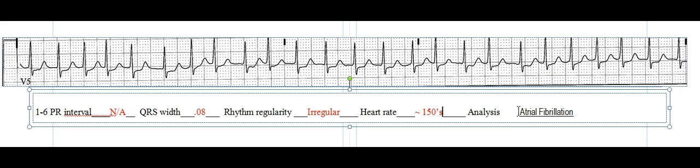Again, this is an irregular rhythm with no P wave. We haven't covered this yet, but it is called atrial fibrillation. And you can leave yours blank, or you can write that in, because in just a couple weeks we're going to be talking about that rhythm anyway. So this is a rhythm that's very irregular. I didn't even bother to try little boxes because I can easily see that the regularity is significantly different as you go through the strip. QRS is about 0.08, maybe a little less. The rhythm is irregular. Heart rate is running around 150-ish, and we're done.